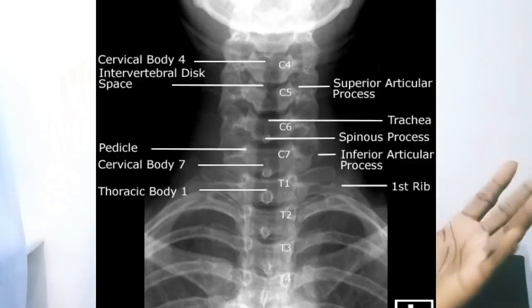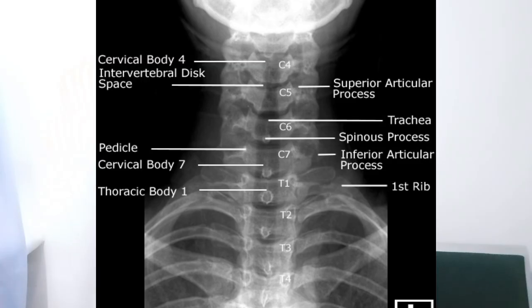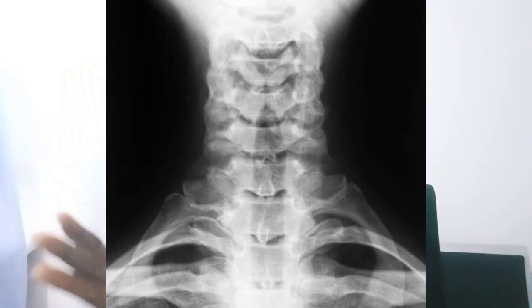For the cervical, you can see the normal cervical picture here, where the spaces between the cervical region are well aligned and normal. For this particular part, there are reduced joint spaces, which can also cause pain in the long run. In some people, when you palpate or press the back, there's no pain there. It's asymptomatic.